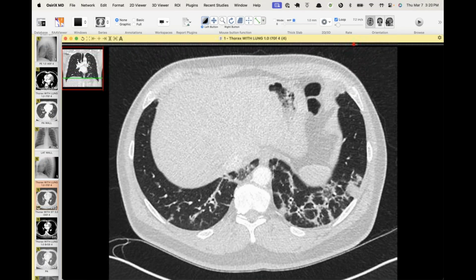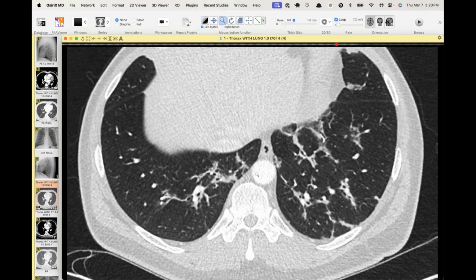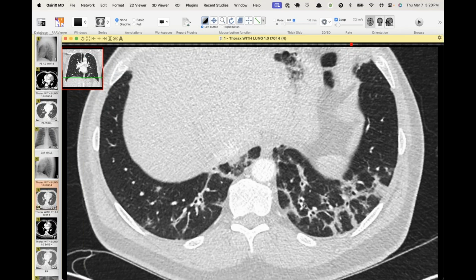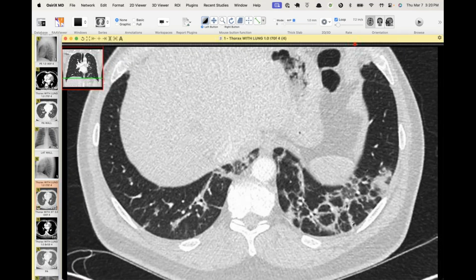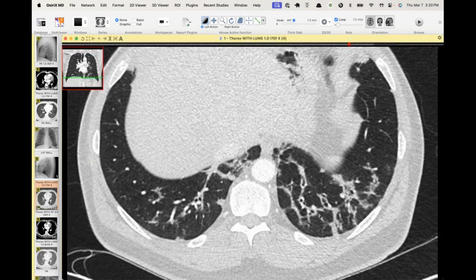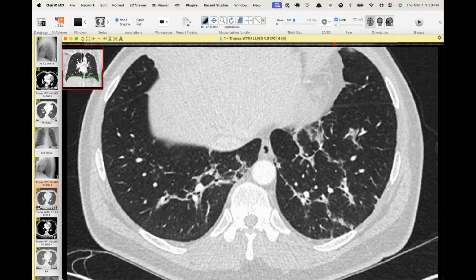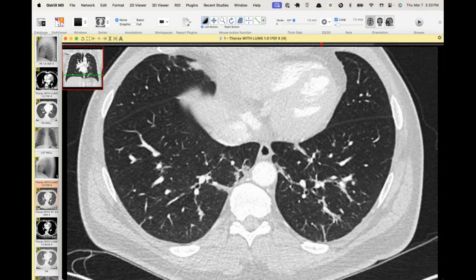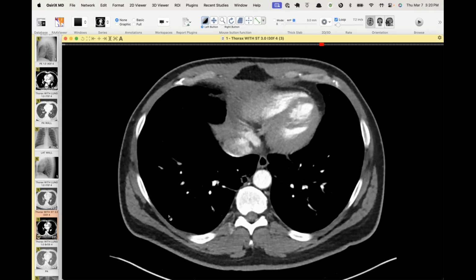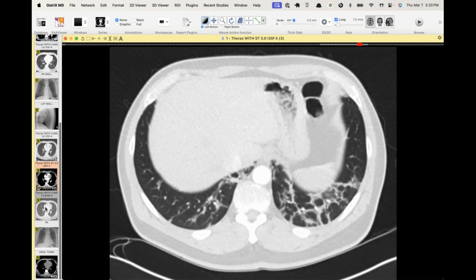And then a few months later, this is really interesting because the discrete nodules have decreased. And now, I would argue it almost looks more like a perilobular appearance of organizing pneumonia, with just peribronchovascular and linear bands of consolidation with these arcades and areas of lobular sparing. So no discrete nodules, and no notable treatment in between there. That was March, and then this is the same time frame, just thicker images.